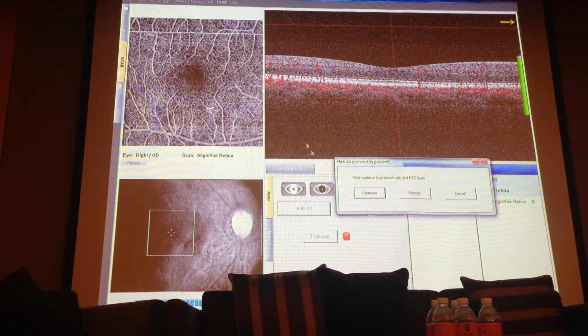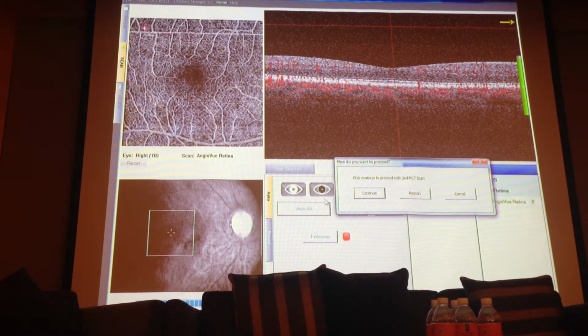And actually, there are hundreds of very thin lines like this. See, straight lines. These come from the motion effect. Very small, but still there. Usually, we can put up with more than 1, 2, 3, 4, even 10 straight lines. Still, we can remove these artifacts with the second scan.